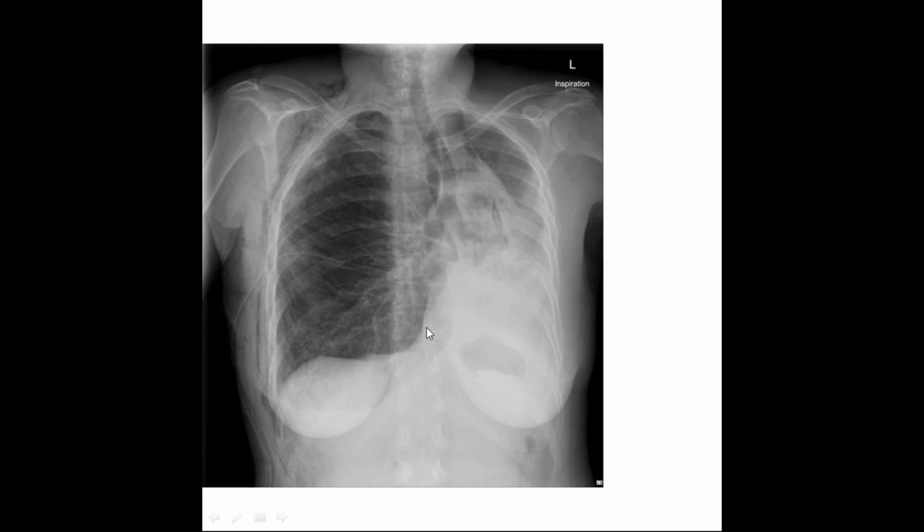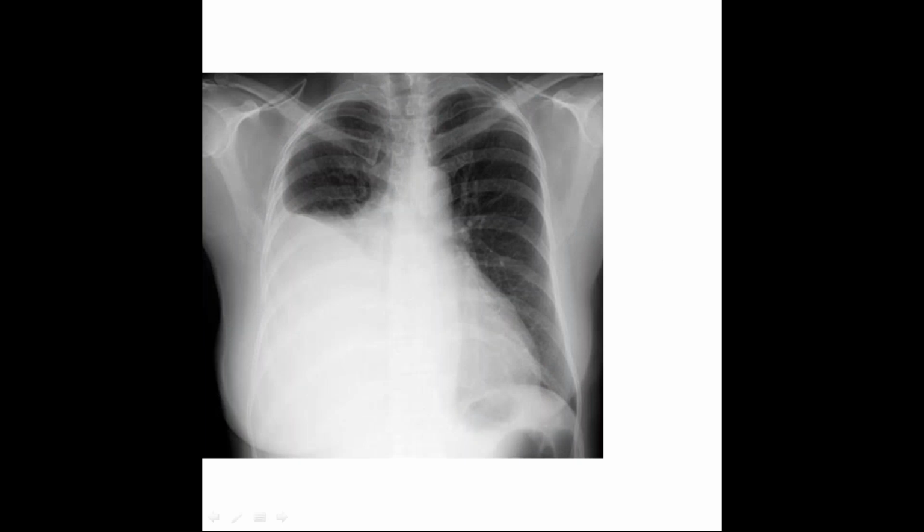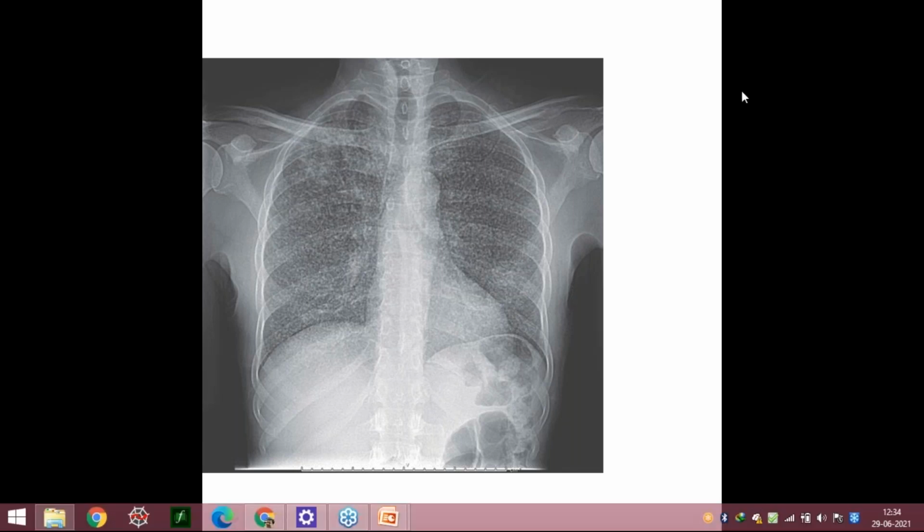Okay. So now we come on to this X-ray. Sorry, yeah, this X-ray. Airway. Is it fine? Shift towards right, no. Slight, not very classical. Not very classical. Anything else? Airways, more or less fine in this patient.